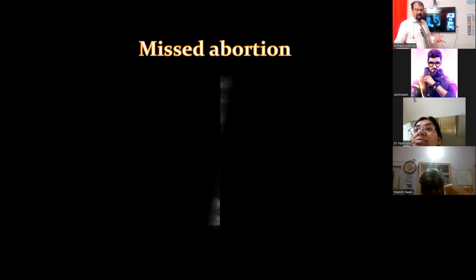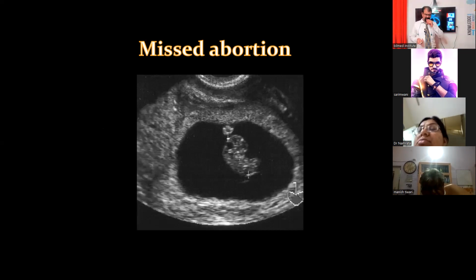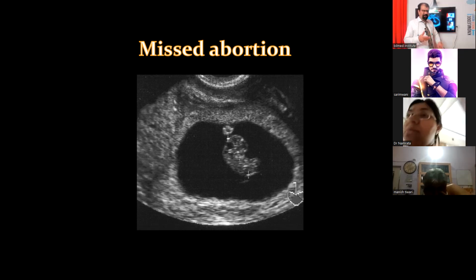Missed abortion. Now, what is a missed abortion? Everybody is very clear with this. Whenever there is no fetal cardiac activity. But more important is that sometimes we get confused whether there is a muffled fetal heart. You are not confident at that time whether these are transmitted pulsations or the fetal cardiac activity itself.